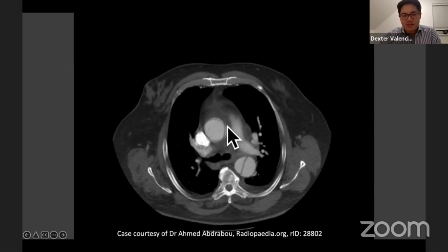What you'll notice is there's an extra added line which we didn't have in any other previous studies, this vertical line going here and this other line here, and that's that intimal flap. This is an acute dissection. And for any of you that are just paying attention from the previous slide, this is involving the ascending and descending. So this will be a type A.